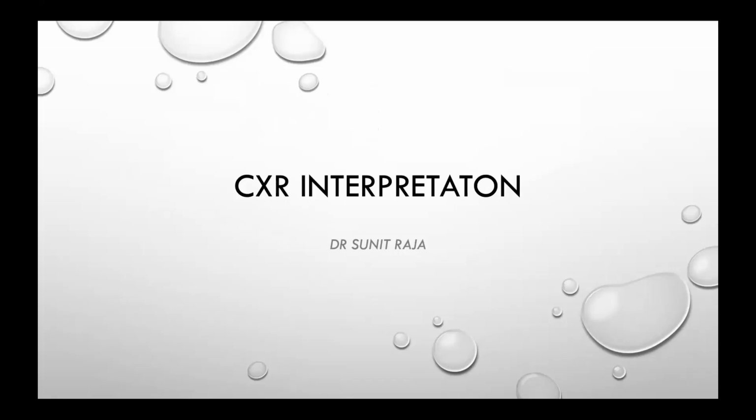So this is a fairly rudimentary approach to chest X-ray, and really the main thing is the structure and things to look out for. Before starting, I'd say the key thing for everyone coming back to training, thank you for doing that, by the way, is really try and spot pathology that isn't COVID-19. I think the pressure is going to be on to say we need to treat all the COVID patients, but the reality of these patients is that they're not treatable. We have to support them through and hope that they get better on their own, which means the real savings here are going to be finding people that are in respiratory failure with treatable pathologies. And your chest X-ray is going to be important for that.